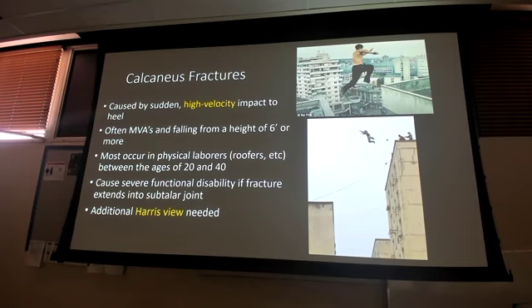Don't worry about the Harris view for here. You'll learn that in ortho next semester. But we see this often in your roofers, your construction workers, they fell off something from great height, landing, fracture of the calcaneus, make sure you take a look at the lumbar spine.